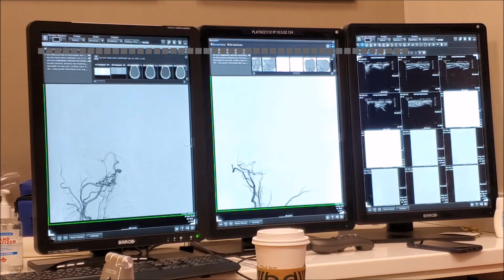See, this definitely feels this way. And those are branches of the internal maxillary. Yes, yes. But this one, some of it is the ascending pharyngeal here.